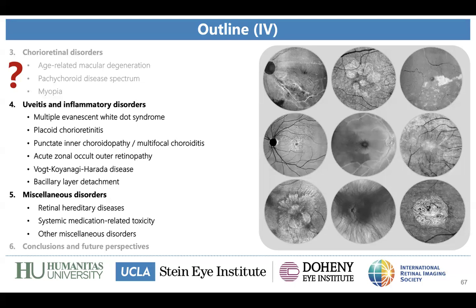So it's very hard to define or to delineate the margins of the atrophy when it's close to the fovea, which is not true for en face OCT. For en face OCT it is very easy; it doesn't matter if it is close to the fovea.